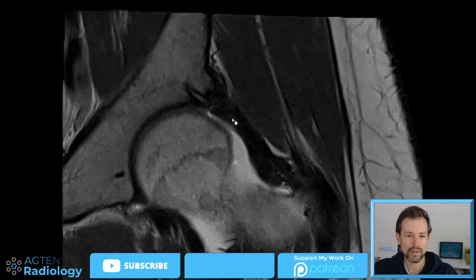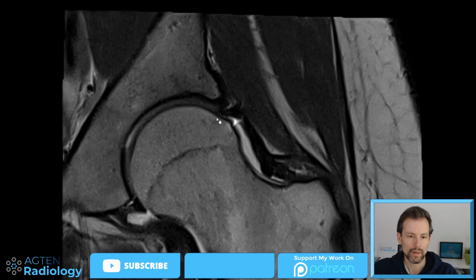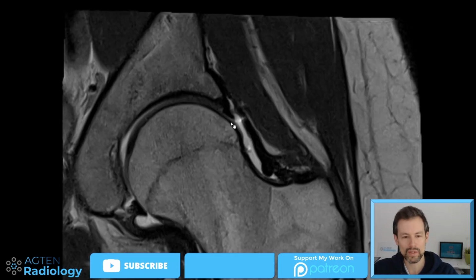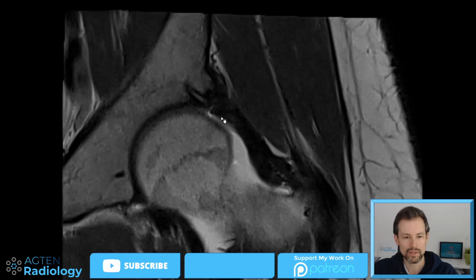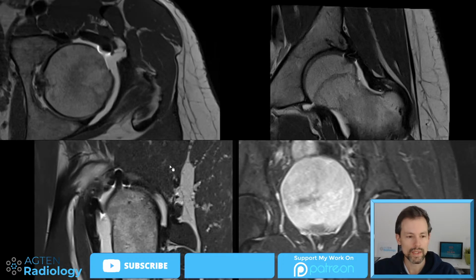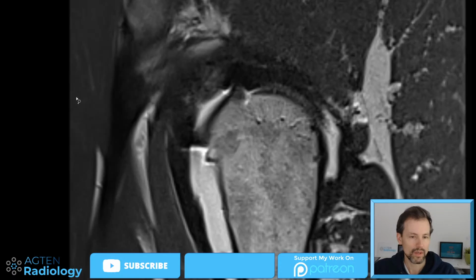So I think this is a good message. Be mindful calling this a dislocated anchor if the anchors are not metallic in the first place. It looks strange, and I had calls with patients that didn't believe me, etc. But it's not a dislocated anchor, right? And also in the surgery report, nothing about a dislocated anchor was mentioned. Okay, good. Then, yeah. So what we wanted to do is have a look at the scar tissue again.